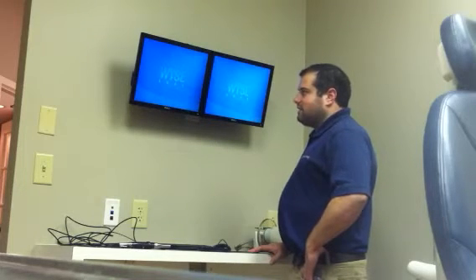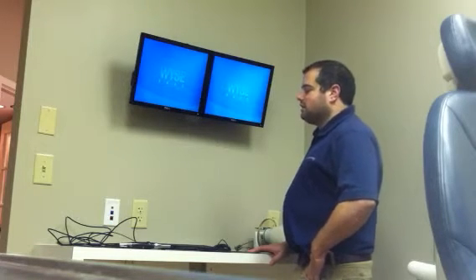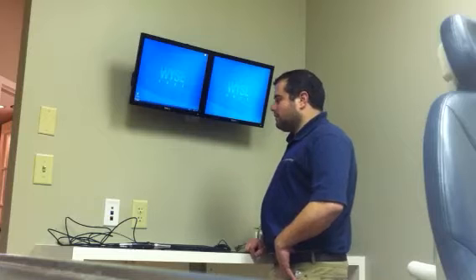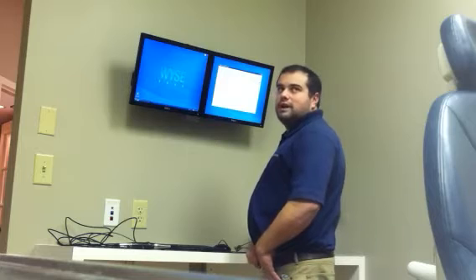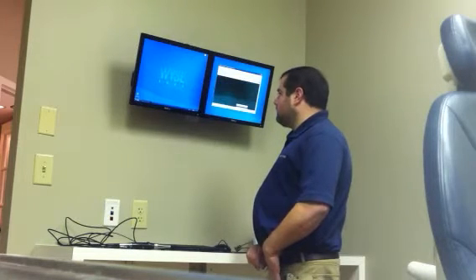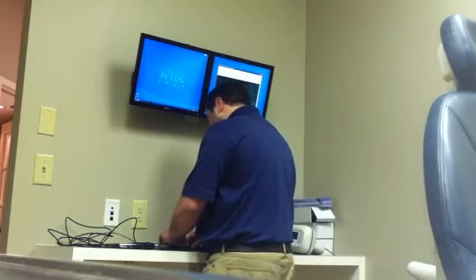I have timed it. The approximate boot time is right around the 30-second mark. It's about 10 seconds till you see the desktop, but there's still a number of processes running that need to complete before the desktop is usable. So in just a moment here, we should see our Internet Explorer page pop up here for our VDI login. And there it is. So I will go ahead and log in with our credential.